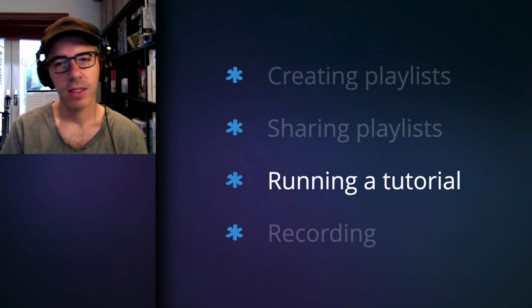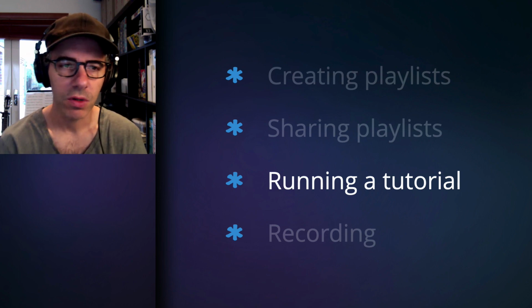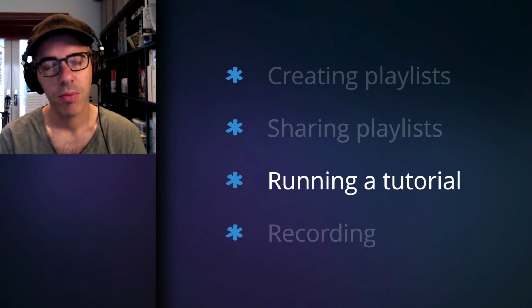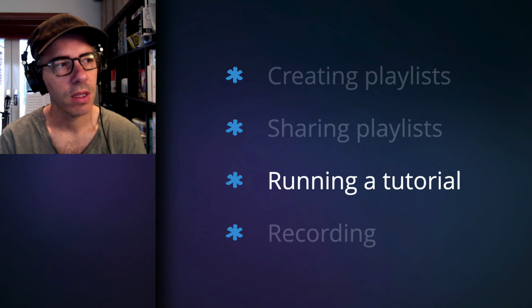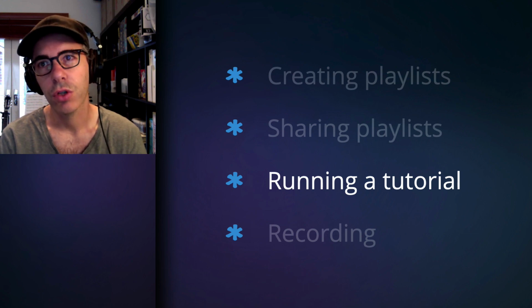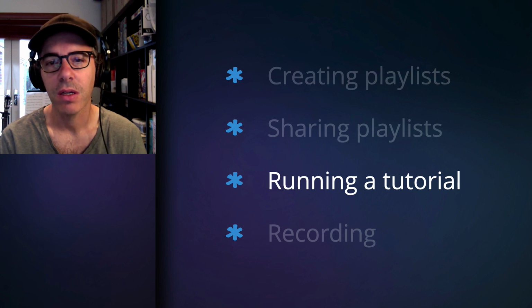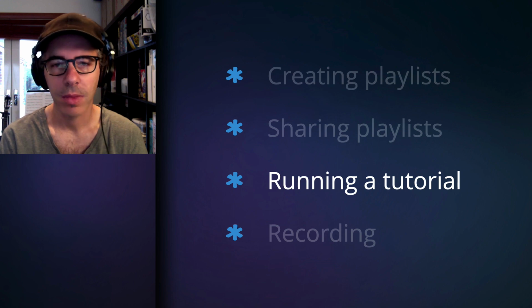Now, there's a few ways that you could run this. You could, for example, do all the scrolling yourself. The problem with that scenario is that the trainee needs to ask you to show a particular sequence and then ask you to go up and down, and it's just not a very pleasant experience, and it makes it actually much harder to do the case.